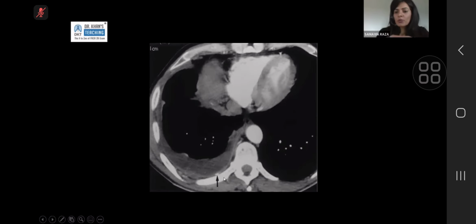So in this case, what would you do? Would you dismiss it? Would you recommend follow-up, or would you manage it aggressively? What I would like you to do is refer it, because there is fluid behind it. It is easy to sample. This pleura can be biopsied under CT. This pleura can be biopsied with a scope and a respiratory physician. This fluid can be sampled, if nothing else, for cells.